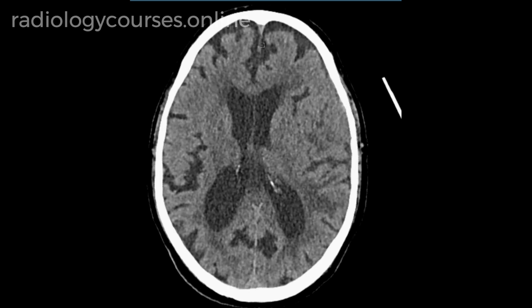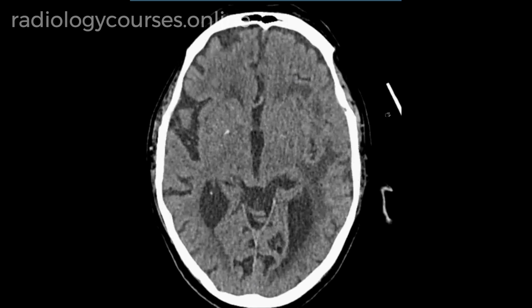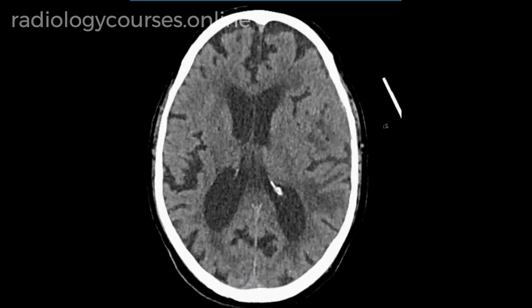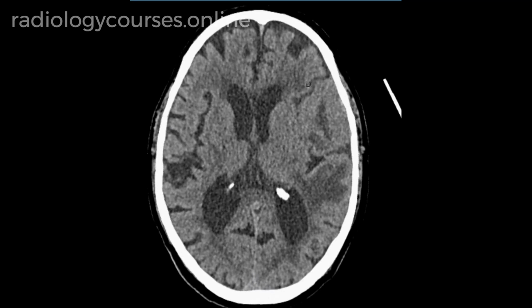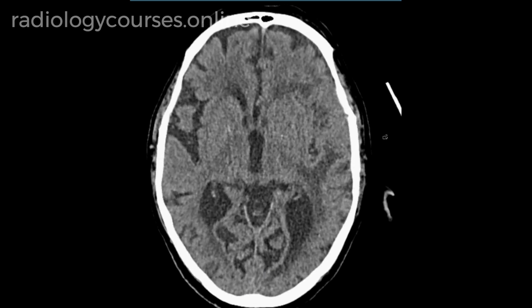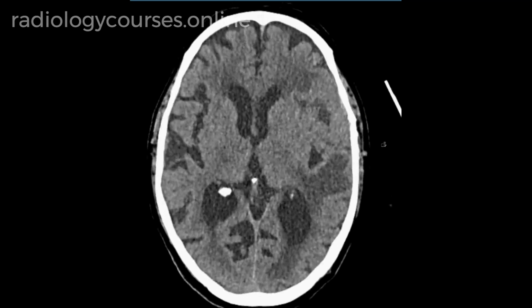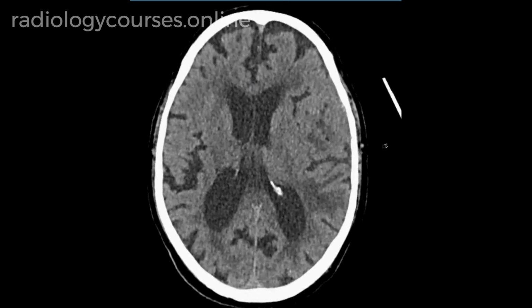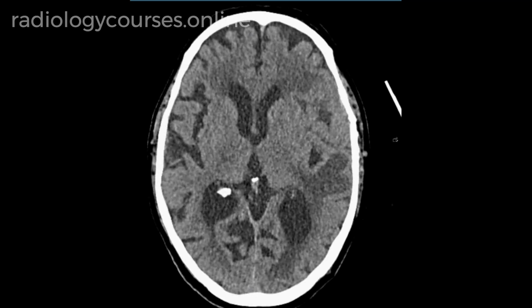And also, if you look carefully, there is a minor midline shift to the right side. So based on this, the features are very likely to represent a space occupying lesion, very likely to be located in the extraaxial space. So the next best investigation would be MRI of the brain with contrast. Alternatively, we can do post-contrast CT as well to confirm the diagnosis of the extraaxial tumor.